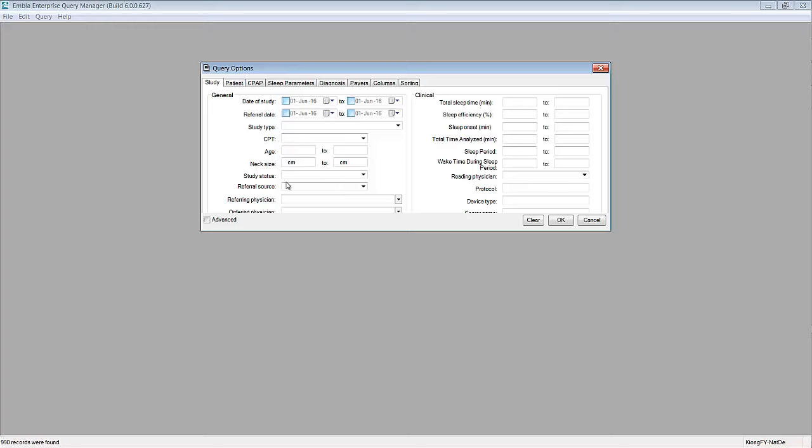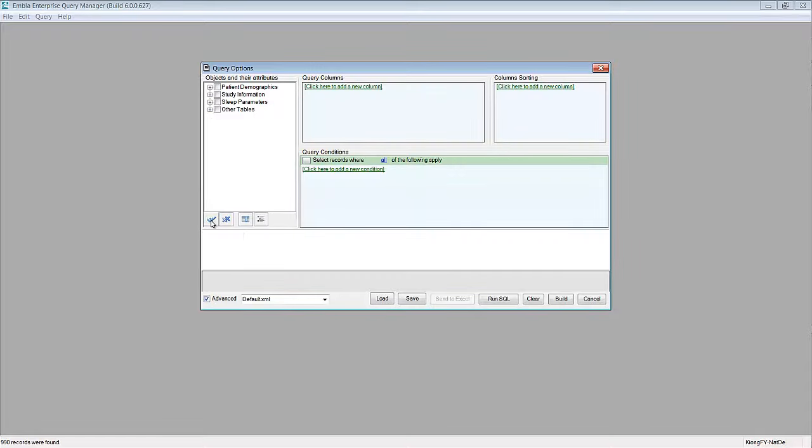For some of you who are well versed with SQL, we have this advanced option where you can use this functionality to create a more detailed search on the data that you want. Although we have prepared some of the prefix here, you can always arrange it into any kind of arrangement that you want, and then build the queries that you want.